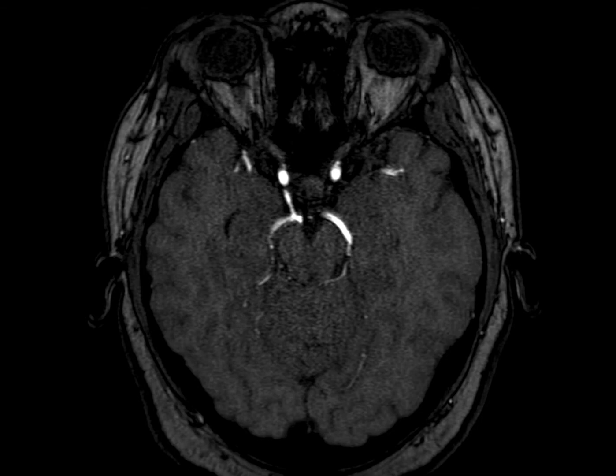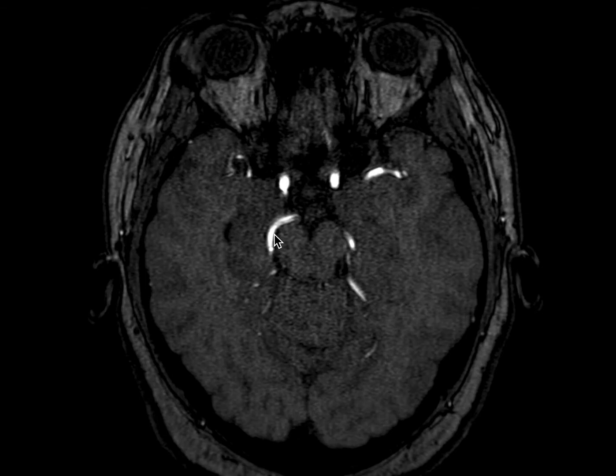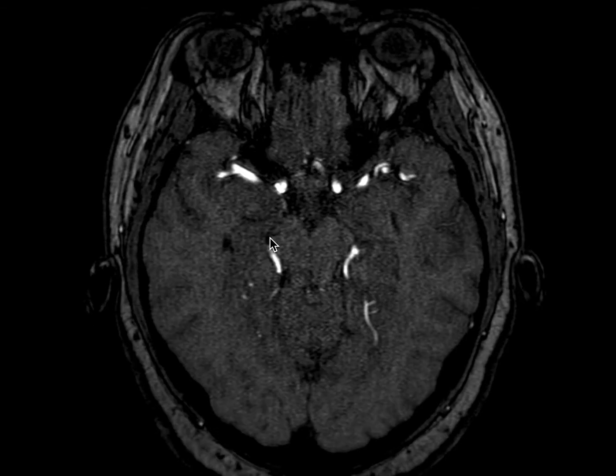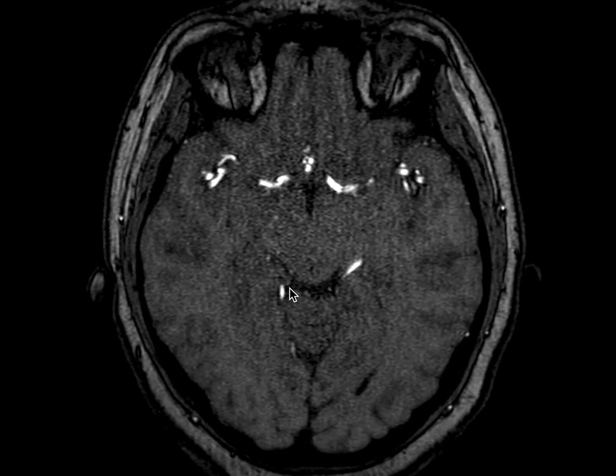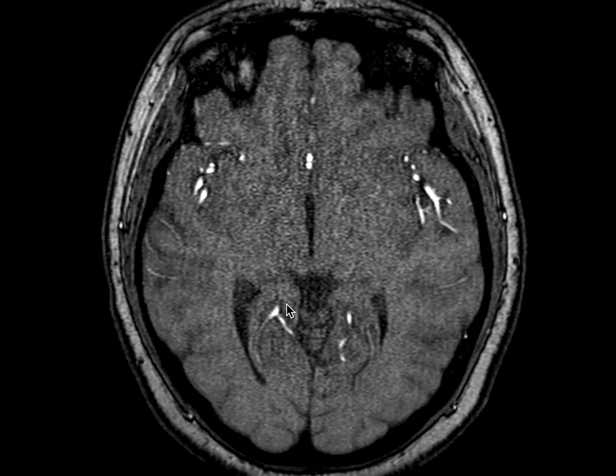We also have the option to evaluate the intracranial arteries with MRI. Here on this T1 weighted gradient echo time of flight sequence, we have a prominent right posterior communicating artery here, going up to the posterior cerebral artery and separating it into its P1 and P2 segments. As I scroll superiorly, we'll see the P2 segment go around the midbrain in the crural and then ambient cisterns, and further up, we'll see its P3 segment right here, adjacent to the quadrigeminal cistern, and then further back, we'll see the distal P4 branches.